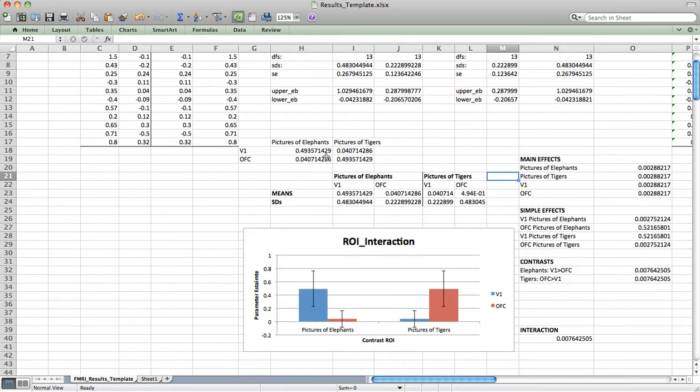Okay, so a lot of these are formulas that you can change as you want. The graph is actually created by these numbers right here. All right, and what it does is it also puts some error bars on there, which is 2 standard errors of the mean. I like 2 standard errors of the mean as opposed to 1, because if there actually is a greater difference of 2 standard errors, that is probably p less than 0.05.